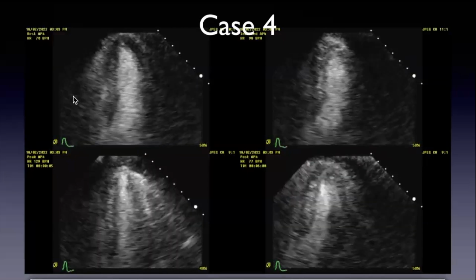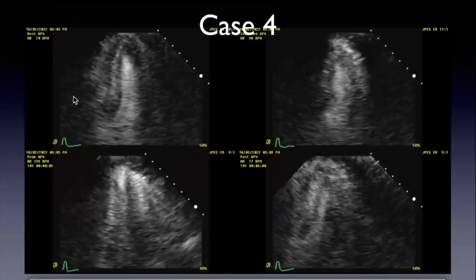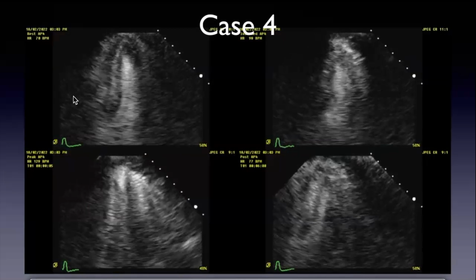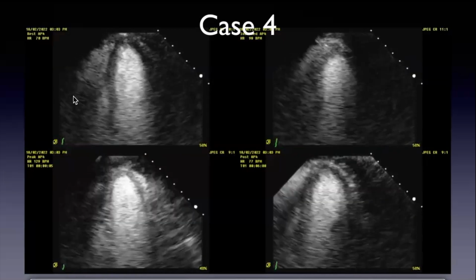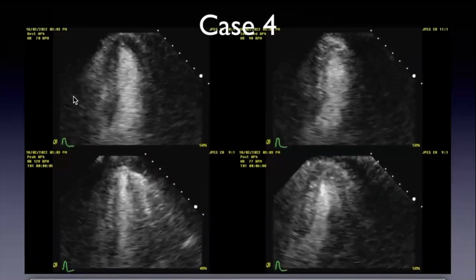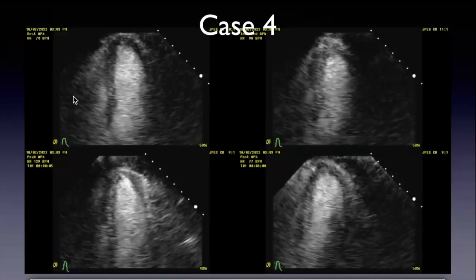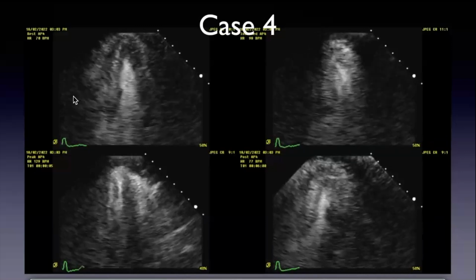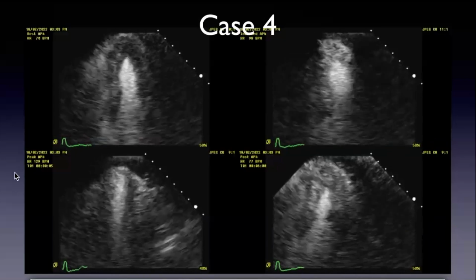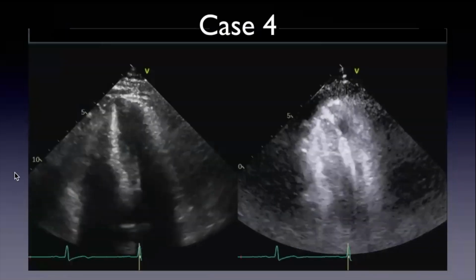We always talk about the apex. A lot of times we look at normal studies and the apex looks somewhat rounded, right? We know that the apex normally is not round. It's actually pointy. It tapers off. So echo foreshortens a lot. That's the advantage of 3D echo when you're trying to get the true apex, and also the strength of MRI. So sometimes it's difficult for us to get the true apex, but if we know what we're looking for and we use contrast, then it's easier.